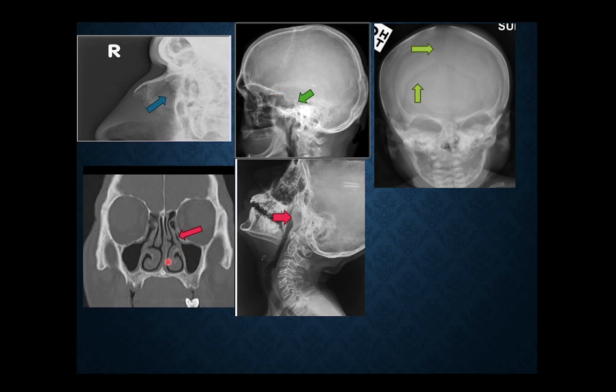This area is pointing towards the osteomeatal complex. This aperture, which is curved like the uncinate process. This one is the uncinate process, and there is the hiatus semilunaris. If this osteomeatal complex is blocked, which sinus is affected? Maxillary sinus.